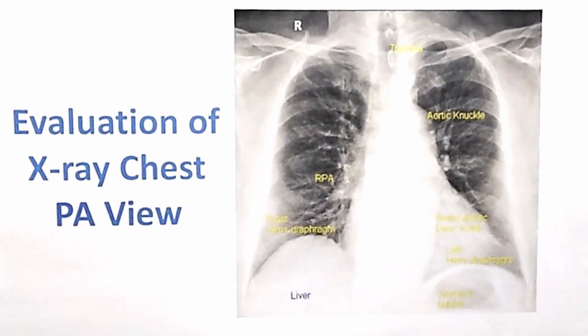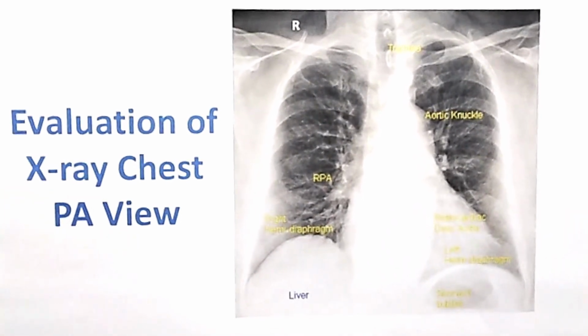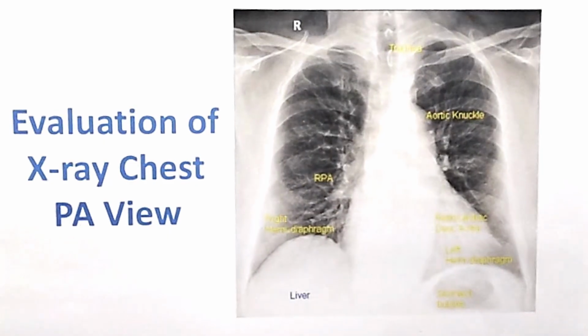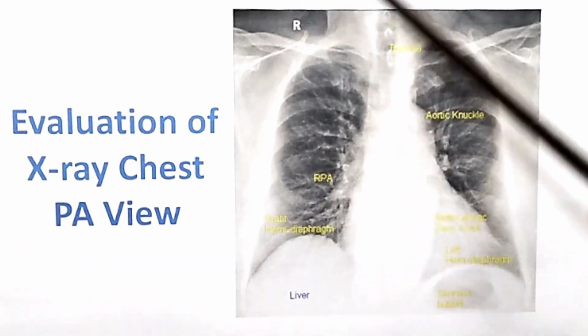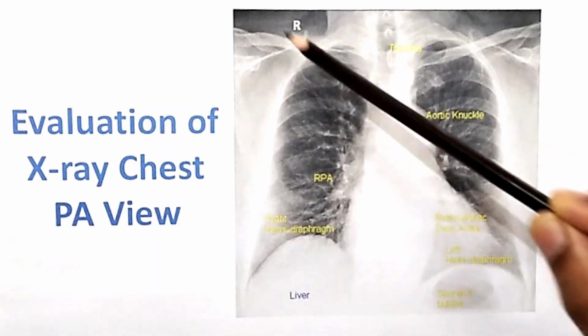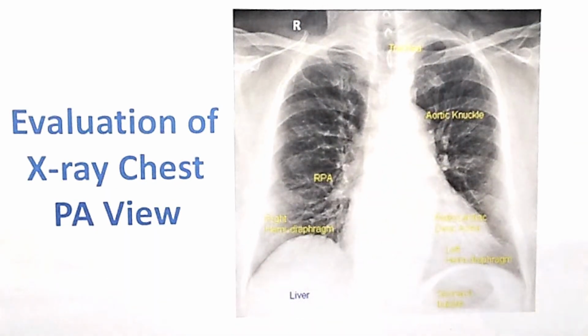First and foremost step while evaluating a chest X-ray, and for that matter any investigation, would be to verify that it belongs to the right person by checking the identification. Then coming to a chest X-ray, we would look at the position marker. When mounting it on a viewer, you have to see to that it is mounted properly. Very often we miss situs inversus and dextrocardia just because we don't check at this marker.